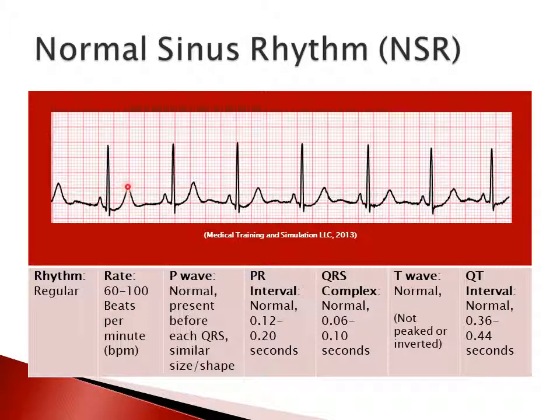Next, we'll look at our T waves. And we can see that there's a T wave present with each EKG complex here. And none of them appear to be peaked, and none of them appear to be inverted or upside down.